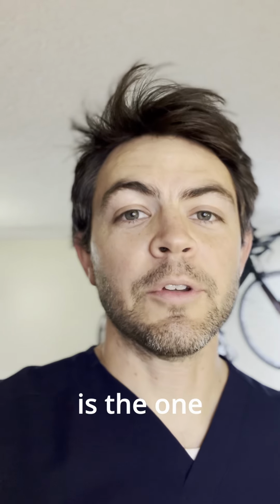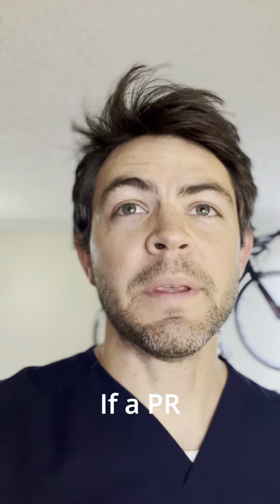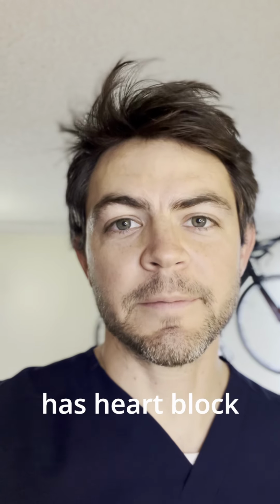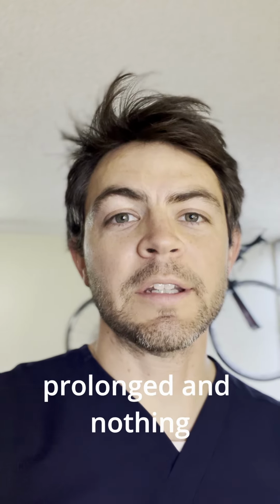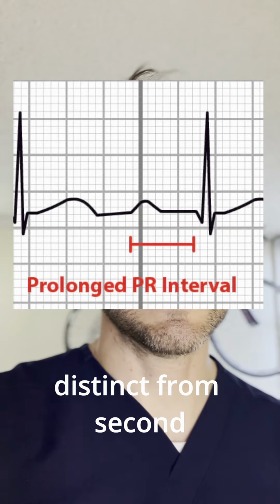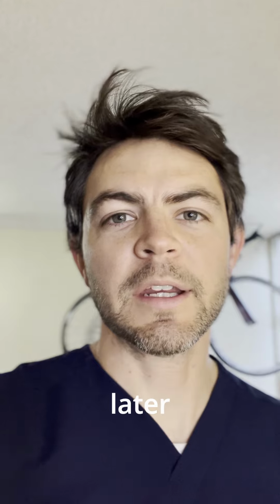The PR interval is the one that's probably the easiest to remember. If a PR interval is prolonged, that is a sign that someone has heart block. If just the PR interval is prolonged and nothing else is wrong with the EKG, that is called first degree heart block, and that is distinct from second and third degree heart blocks, which we'll cover later.